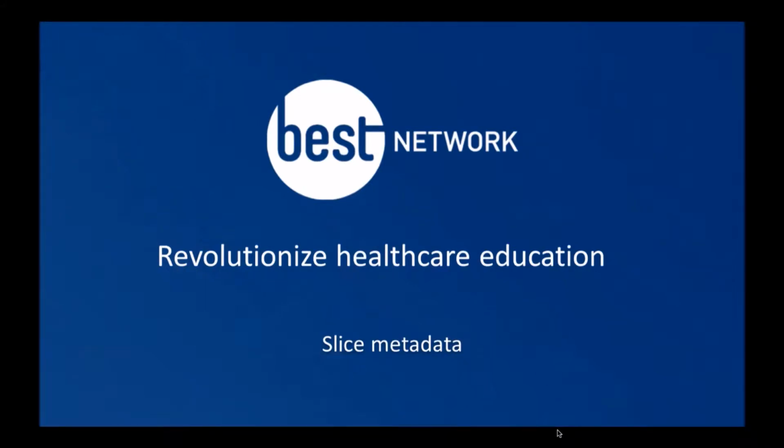Hi, this is Stephanie from the BEST Network, and today we're going to talk about the metadata associated with all images on the SLICE image bank.